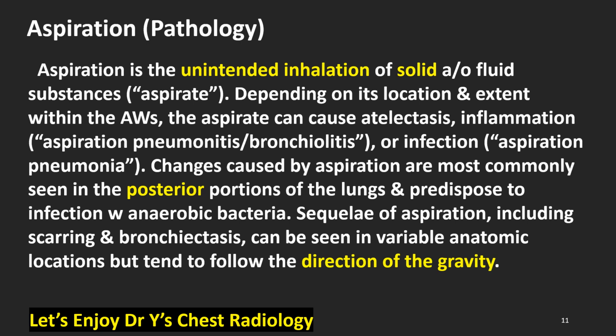Changes caused by aspiration are most commonly seen in the posterior portions of the lungs and predisposed to infection with anaerobic bacteria. Sequelae of aspiration, including scarring and bronchiectasis, can be seen in variable anatomic locations but tend to follow the direction of gravity.